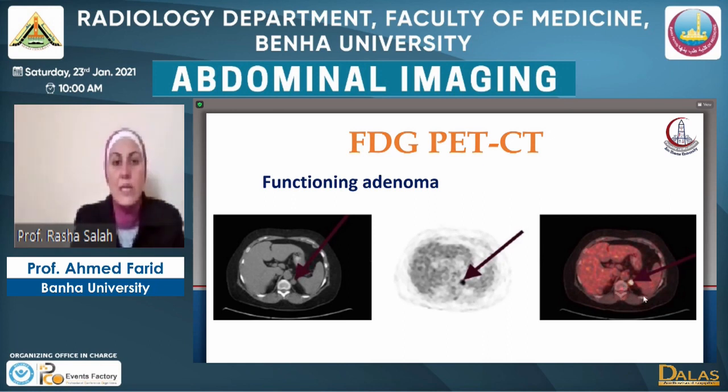We can't discriminate by this increased FDG avidity if this is a benign tumor or a malignant adrenal mass. So we can't characterize depending on the FDG uptake, because benign and malignant adrenal lesions could have increased FDG uptake.